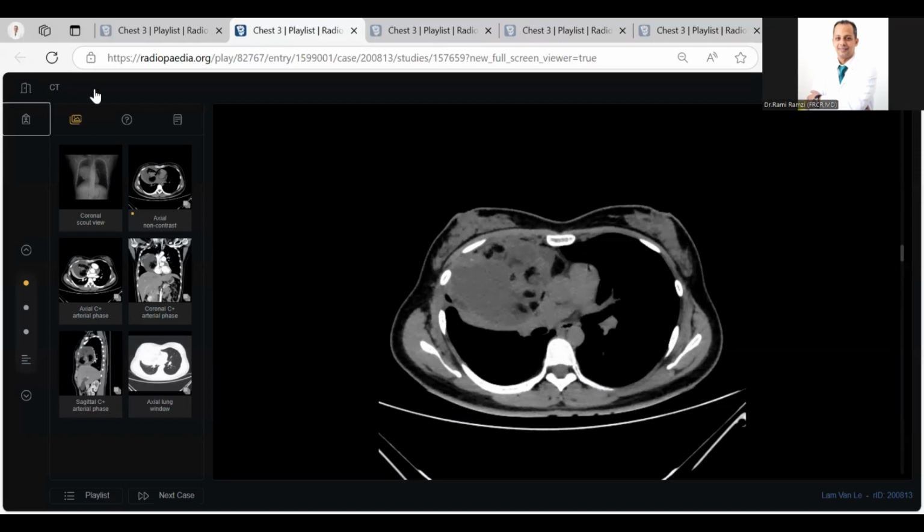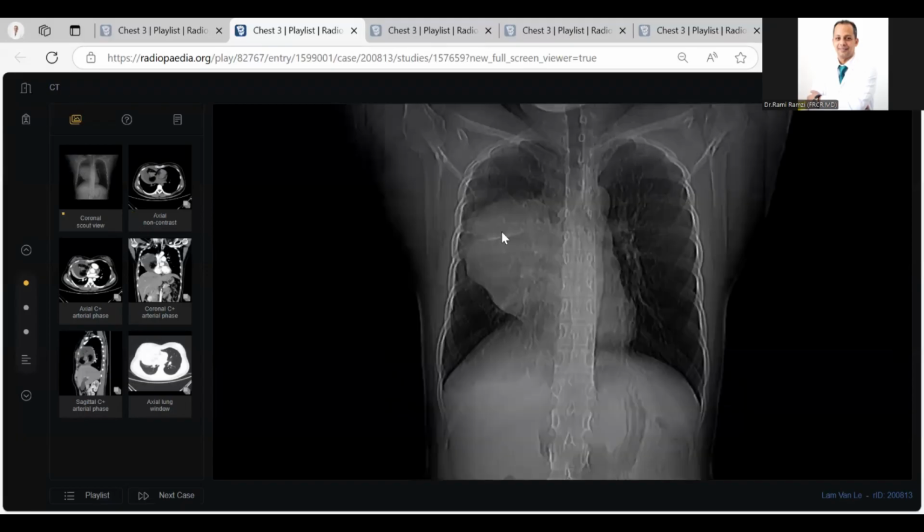This is a scout film. You didn't tell me this point. This is very important to the examiner, that you know this is a scout, not an X-ray. Second point, you say this is an anterior mediastinal scanogram. Then you tell very well this is a lobulated mediastinal mass obscuring the heart.